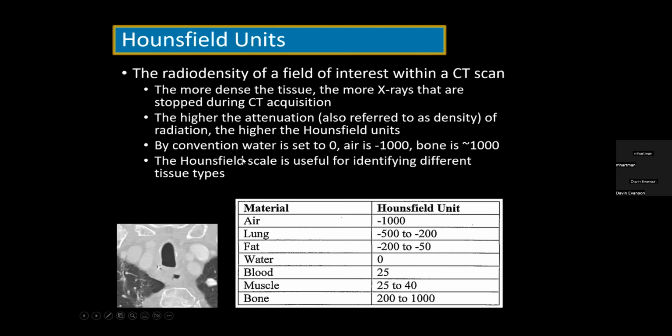We went over Hounsfield units again. I cannot stress the importance of this. A lot of interns and house officers who have never taken our course are not familiar with the topic of Hounsfield units, but it's pretty simple. It goes from -1,000 to 1,000, air to bone, and water is 0. And we'll be looking a lot for blood, anywhere at 25 to 50 Hounsfield units.